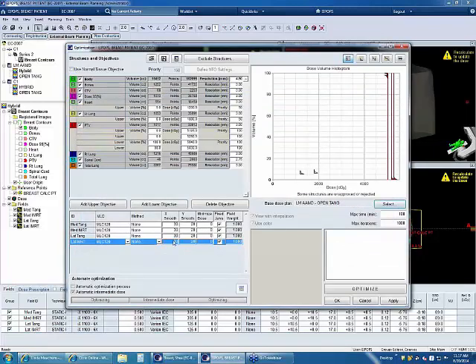So my smoothing is at 30 and 20. You know what smoothing does. It removes the drastic fluences so that it's more easily deliverable on the machine. And I have all of my objectives in here.